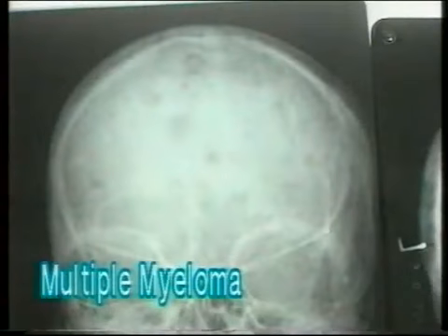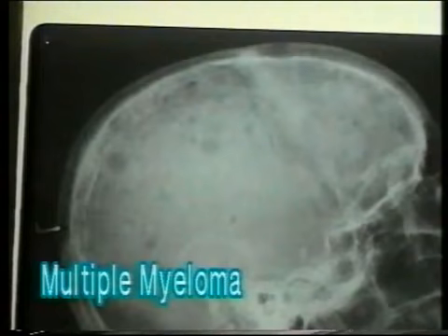In multiple myeloma, the skull shows characteristic radiolucent circular shadows 2 to 5 millimeters in size, as if multiple holes are punched out in the skull. This is a typical appearance of skull in multiple myeloma. In Paget's disease, there is a thickening of the vault and multiple areas of dense white sclerosis with few areas of radiolucency. This is a skull X-ray in Paget's disease.